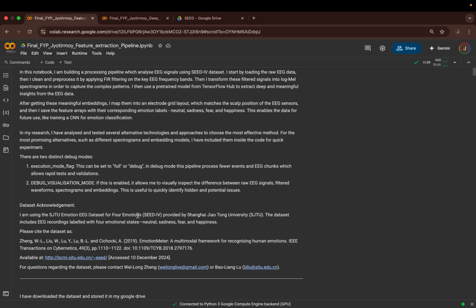Users simply upload their EEG data and the system uses the trained model to predict emotion, providing immediate contextual feedback and practical suggestions to help manage or improve their mental well-being. My project has four main components: the EEG feature extraction pipeline, deep CNN model training, API inference service, and the front-end interface. In this video, I'll walk you through each component step by step, starting now with the first component, the EEG feature extraction pipeline.